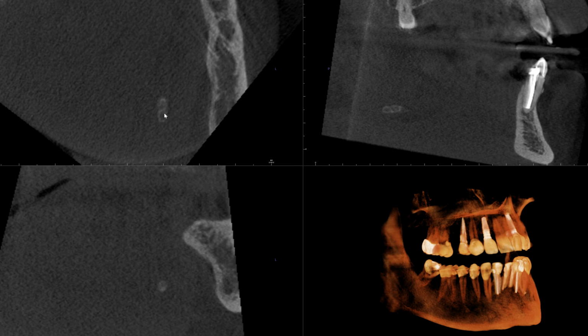There are different ways that different calcifications in the head and neck can appear. The most common ones are tonsilolith, but also lymph node calcification and something like sialolith. They do appear as well, and the location is obviously different, but their appearance can be different as well.